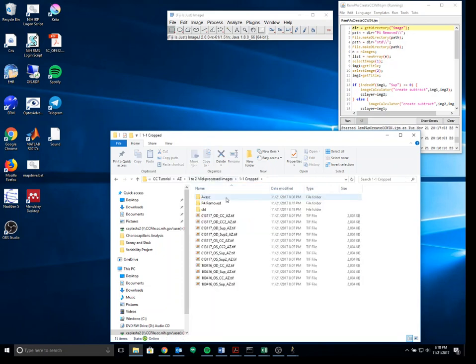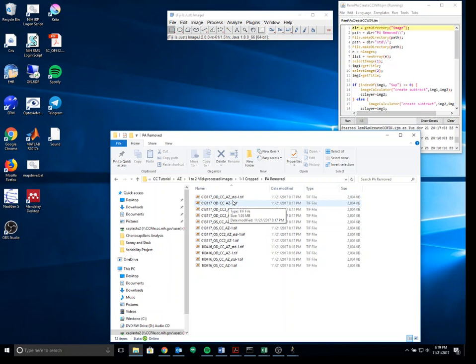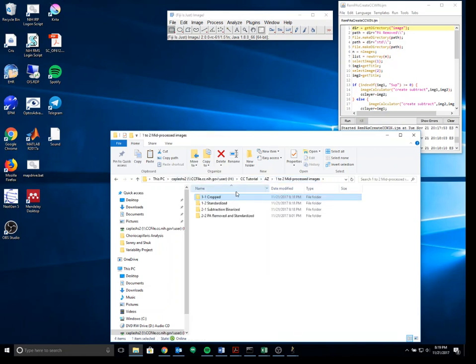And so the ones we're really going to be working with are these ones, projection artifact removed. And you'll notice we now have double. We have a standardized version and a non-standardized. And when we're saying standardized, we're saying that the image is standardized within itself, within its own mean black and white ratio. The implications of this I'm not entirely sure of, and I'm not sure if Marib is entirely sure of, but it was just done as sort of a cautionary measure in case it does turn out to be significant.